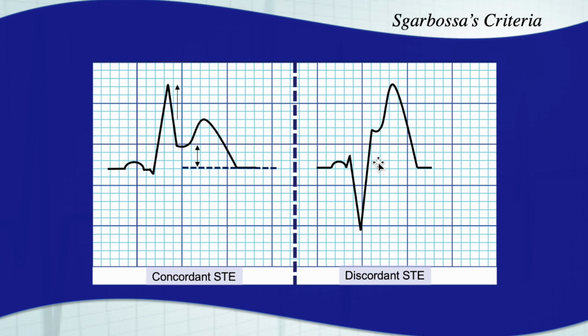Early repolarization. A lot of normal variant ST segment elevation that you see in leads V2 and V3 on a standard, normal sinus 12 lead with somebody without any complaints might have up to 1 millimeter of elevation in those leads because of the T-wave discordance.